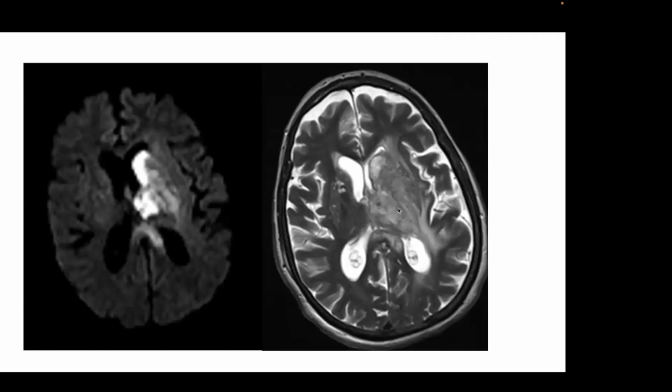Retrograde filling here of the sigmoid sinus into the transverse sinus, and you can see it's refluxing down the other side without any filling of the straight sinus or the superior sagittal sinus. So that imaging, which not only does not look like an arterial infarct, it looks very much like a tumor, was all due to venous infarction from this deep venous occlusion. So again, keep venous disease in mind, particularly when you see abnormalities involving the thalami, or you see non-vascular territory ischemia.